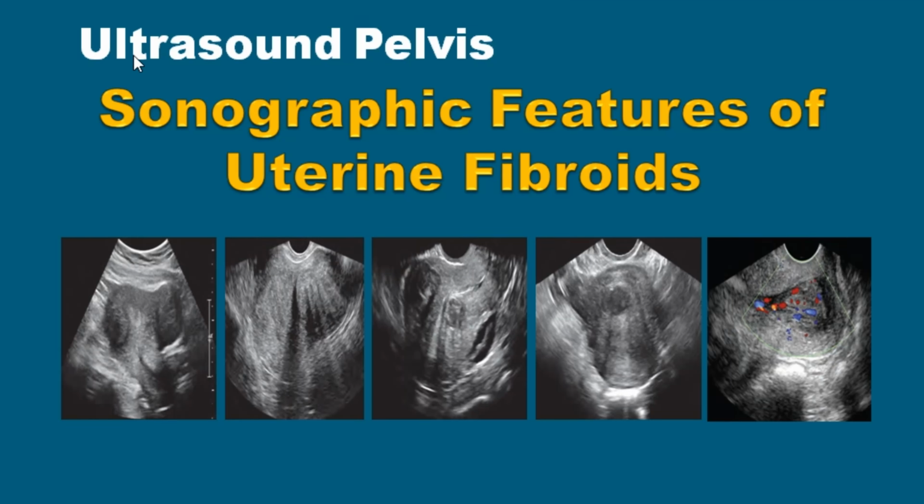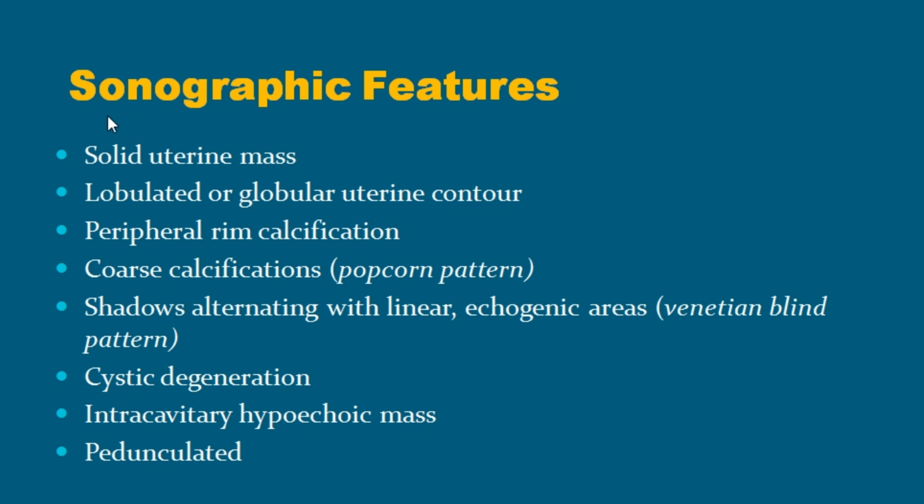Today we are going to discuss the ultrasound of the female pelvis. In this video, we will discuss the sonographic features of uterine fibroids. Now we will discuss the sonographic features of fibroids.